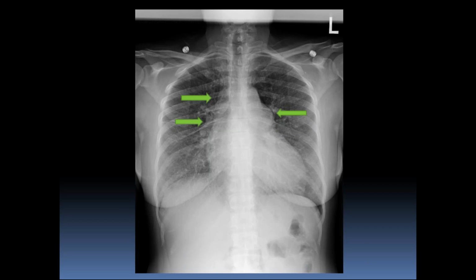So differential could be mediastinal adenopathy, but you can also think about some pulmonary hypertension, because on that left side you don't really know if it's going to be the pulmonary artery or something large in the AP window, because you know that on the left the pulmonary artery sits right above or superior to the left main bronchus.